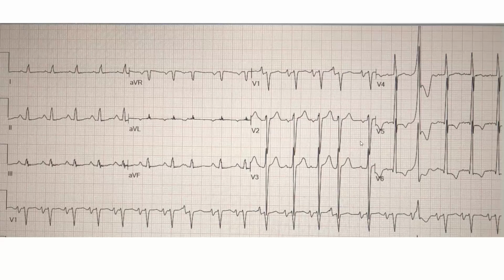So this EKG shows a pronounced LVH voltage feature in the precordial leads, yet small QRS voltage, less than 8 millimeters in the limb leads. Whenever you see that big discrepancy, this is diagnostic of cardiomyopathy pattern or LV systolic dysfunction pattern. This is called the Goldberger criteria.